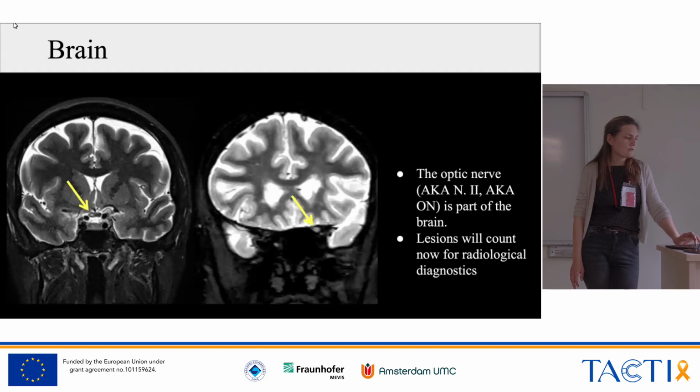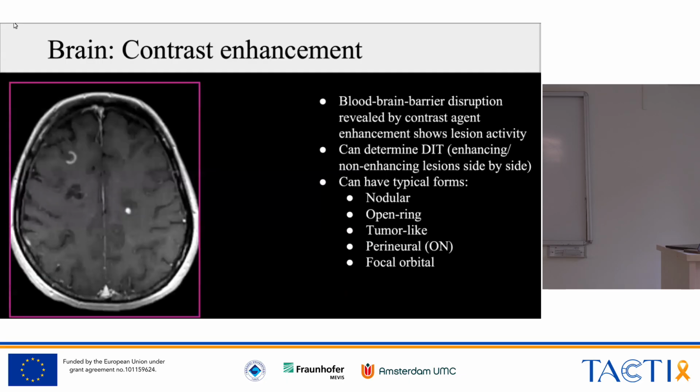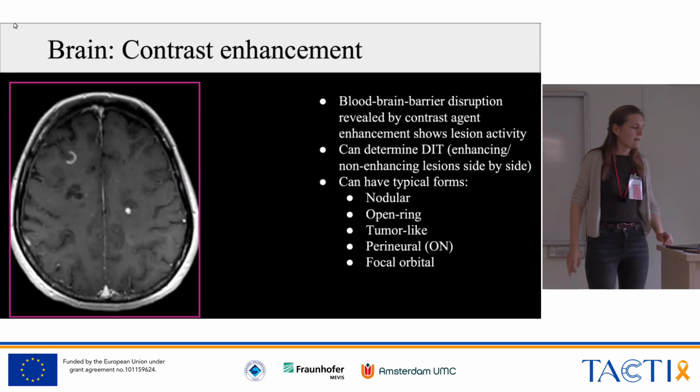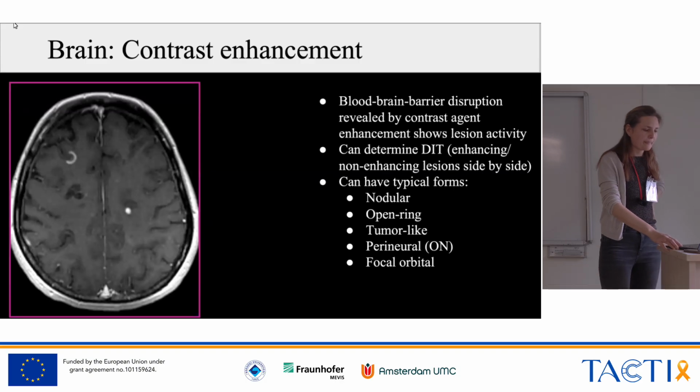And what you have to learn there is that an inflamed optic nerve is brighter than the white matter. See here, it more looks like gray matter, but it should look like white matter because in fact it's a fiber tract, so it must be like white matter. And this is what inflammation looks like. And in MS, those lesions can be very small. Like on the left image, it's only part of the optic nerve. And also the location is very important.